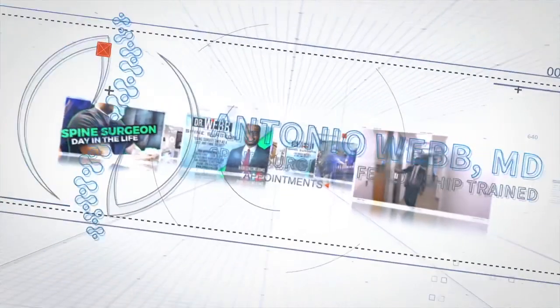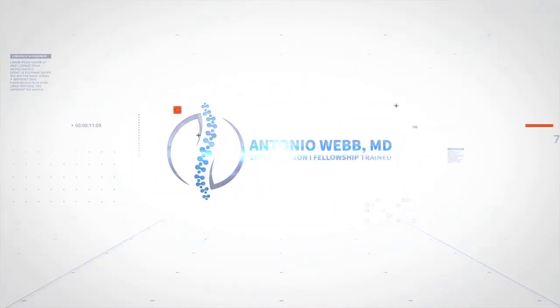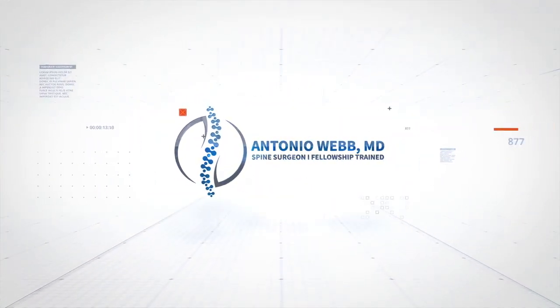In this video, we're going to be going over how to read a lumbar x-ray. I made another video about lumbar MRIs and I'll put that right up here.